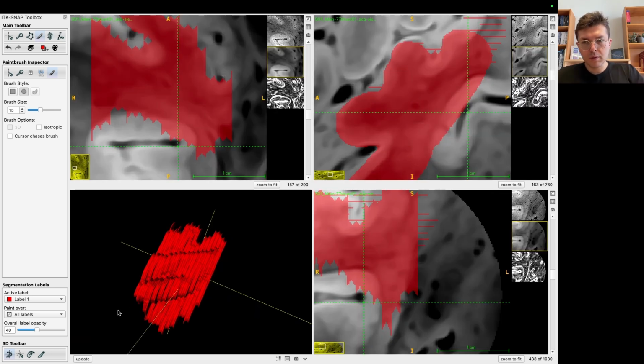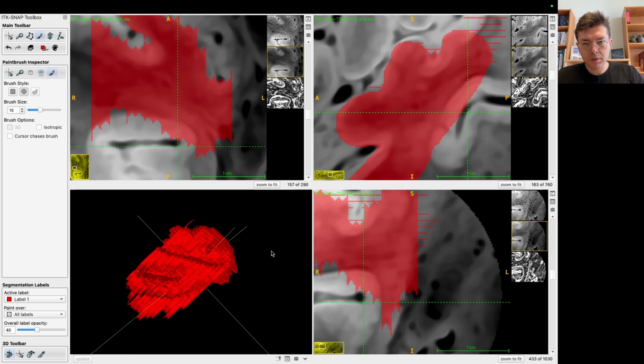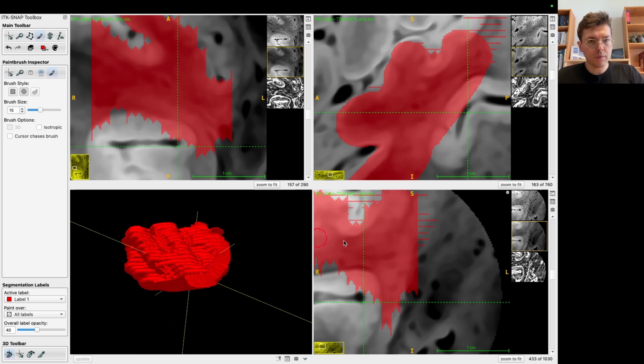Okay, now let me see how is the geometry here.